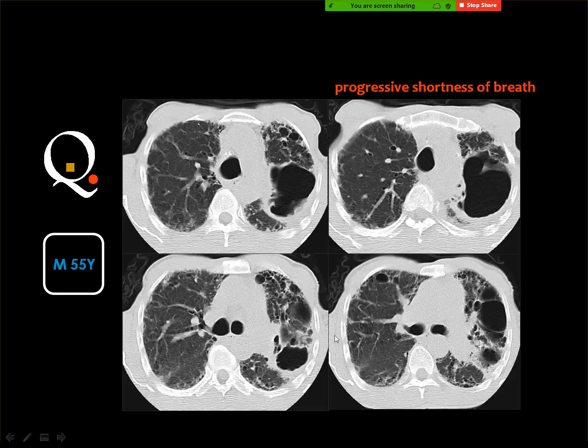What do you see? Is this a diffuse lung disease or focal? Yes, it's a diffuse lung disease. Which type? Interstitial, alveolar, miliary, cystic pattern? Interstitial with cavitary. Yes, this is interstitial disease with cavitations, and these cavitations are nothing but cystic bronchiectatic changes.